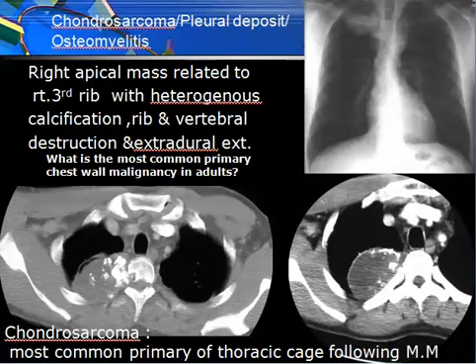But in multiple myeloma, we expect that the bones are involved. Here the soft tissues are more involved. And in pleural deposits, usually there is no such dense calcification.